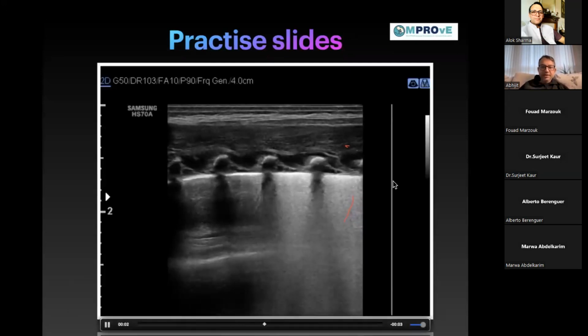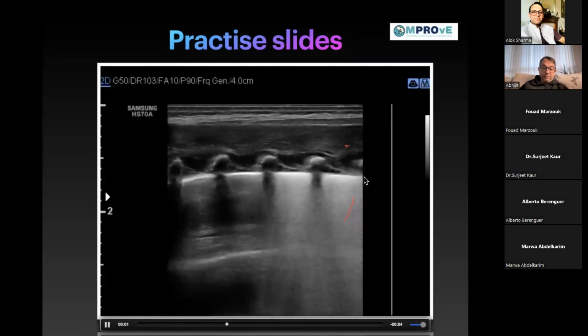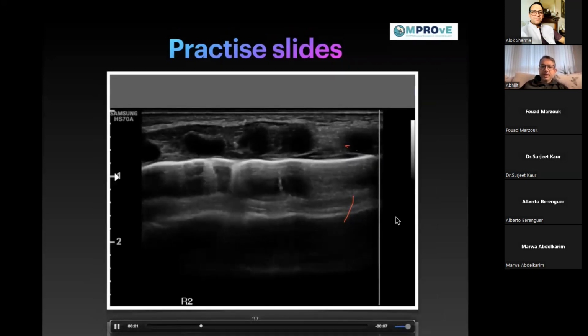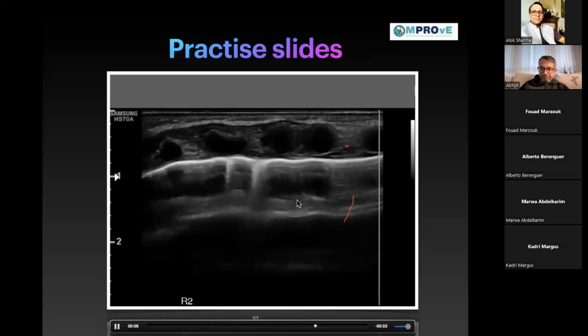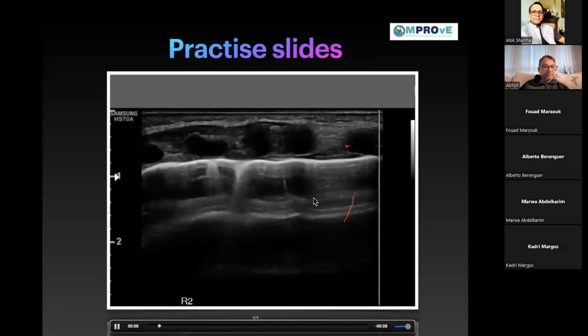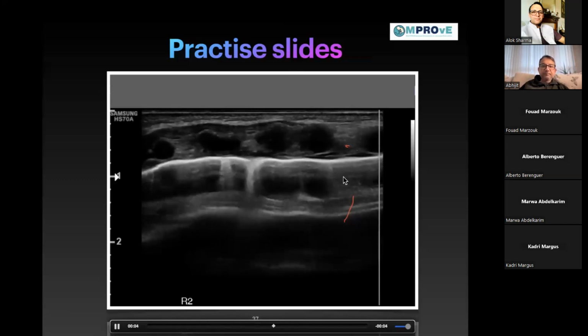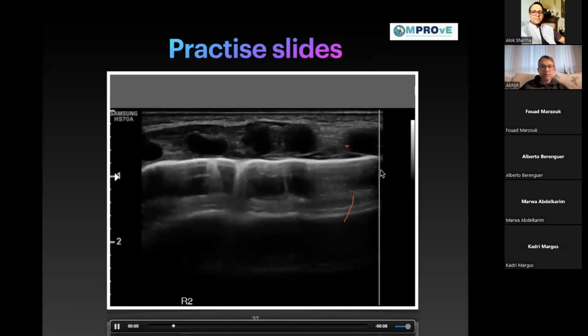Again, another scan. TTN. That's a double lung point, no brainer, excellent. So I'll not go through that again. This one is pneumothorax, I think. Pneumothorax. And that's the whole reason for keeping this slide here. This is not a pneumothorax. It's the lung slide.